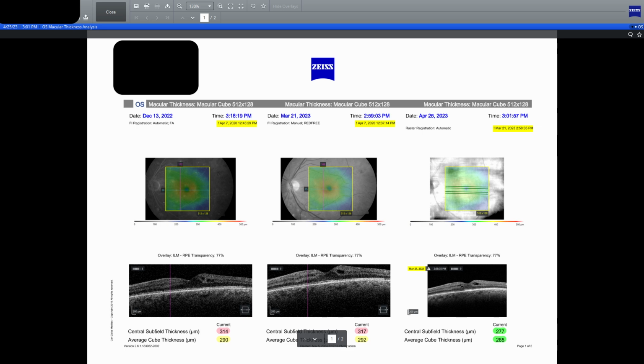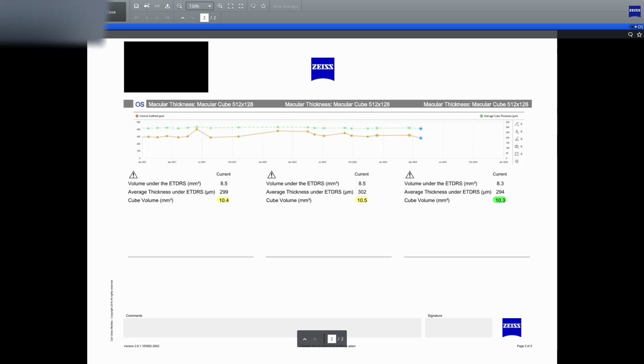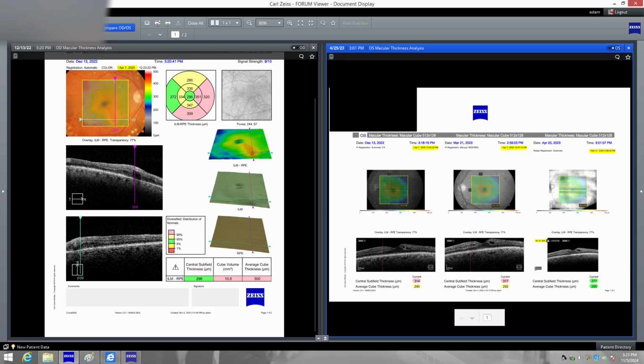And why would you do it? Well, firstly, because it takes some time to prepare those kinds of analyses. If you want to put a specific frame of the fluorescein angiography or a particular part of the OCT that you're interested in, and you want to store it for the next follow-up, or the patient will come for a laser treatment and you don't want to start all over again. So this is one great thing. Why would you want to store your view?